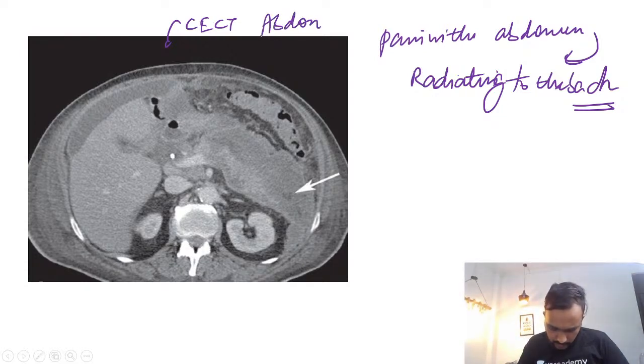So what are you able to see in this case? Anyone guys, what are you able to see in this case?